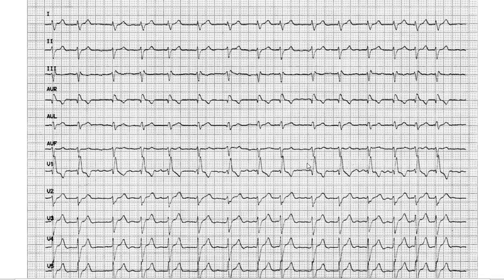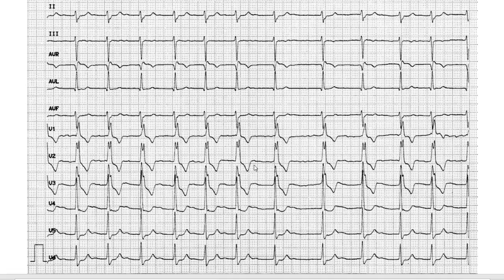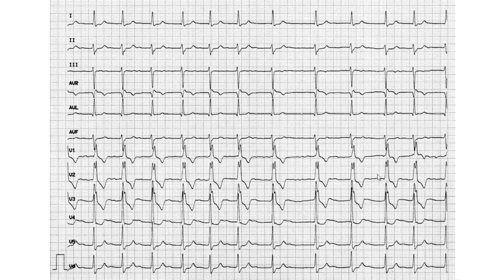And also, let's see V1. Oh, sorry, I jumped into the other question. So V1, does V1 help us? Oh yes, V1 helps us. There's a jiggly line that has no explanation, and here's V2 as well. This is definitely fibrillation. Okay, see how tricky it is to miss fibrillation? Always have a universal view and always keep this in mind. Irregular, and you have trouble seeing P waves, go look around for something that might be fibrillation, okay?